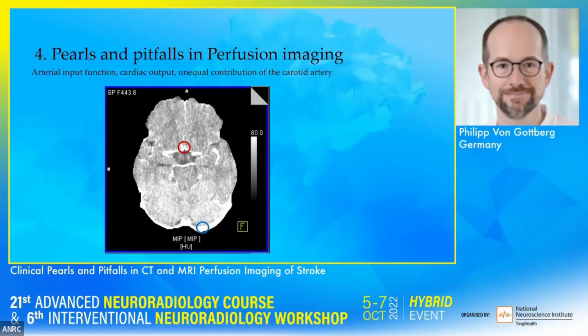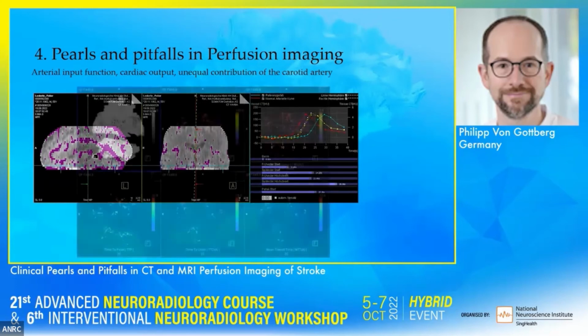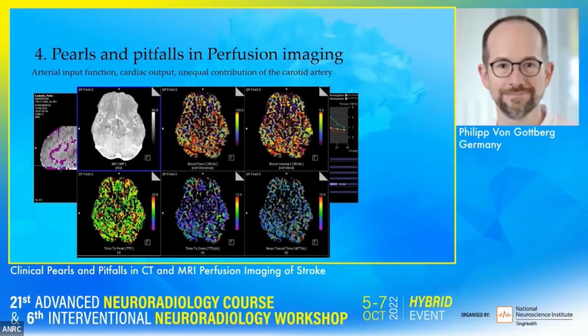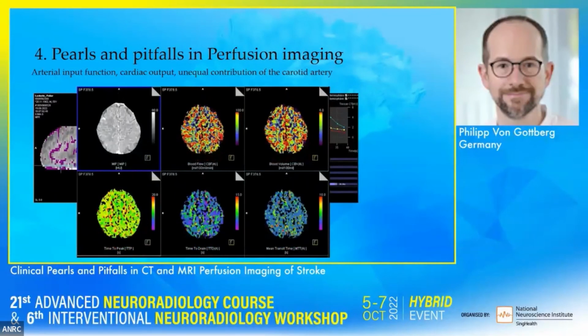If we apply this to this very examination, you can see that this actually smoothens the lines, corrects the lines, and we will be able to have better information in the image. And this is actually now a readable CT perfusion image.